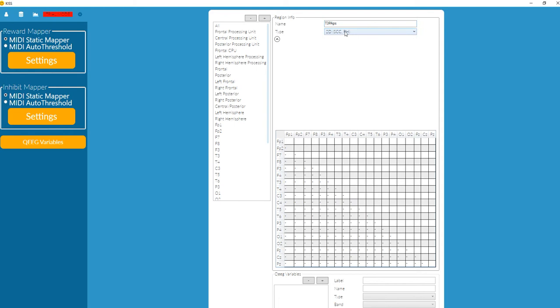It will be a coherence or phase variable, not a magnitude, relative power, or peak frequency. So we go to the T3, we look at T5, T6, we click on these variables and we're adding them to the spectral variable that we are creating.